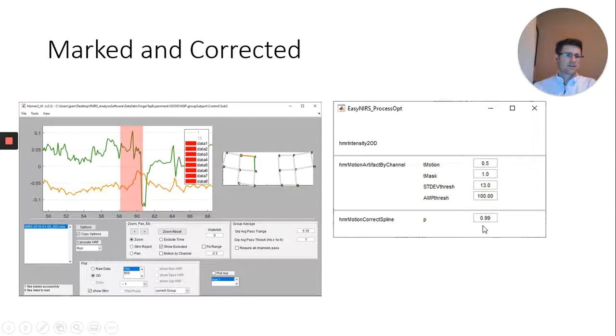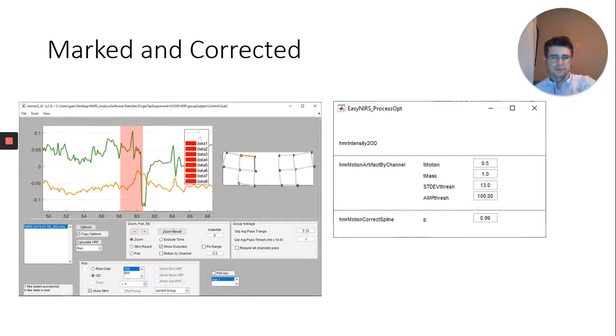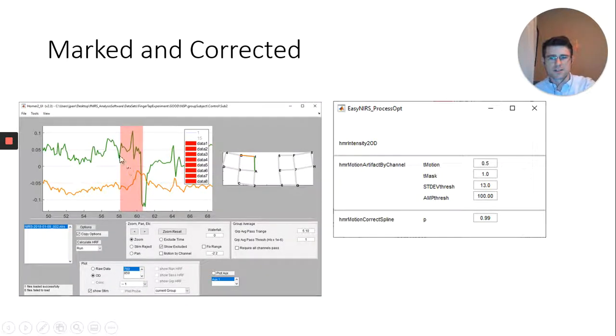And then I use the standard 0.99 as my P input. So now I want to correct it. Oh, and I actually got ahead of myself. So I correct within here. Comparing this big drop here to this data, which actually maneuvered in such fashion, you'll notice there's still this big drop here. So I've corrected it to some extent, but I still have a pretty nasty drop there.